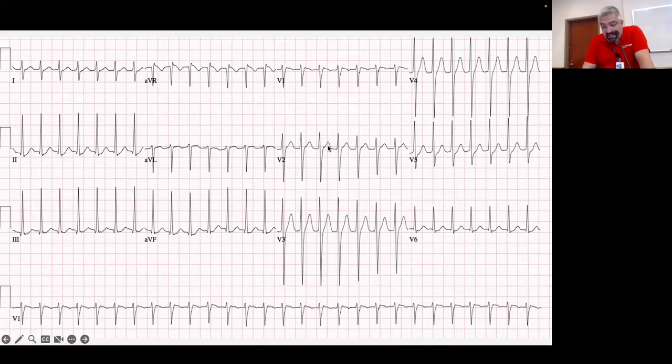Minutes? So you can see, let's see, I'm trying to find an example on here. So here, it almost looks like just a little bit of distortion in the T wave, because look, the T wave is actually, you see this little blip here on the side of the T wave. That lines up with that, which is what the retrograde P wave is.